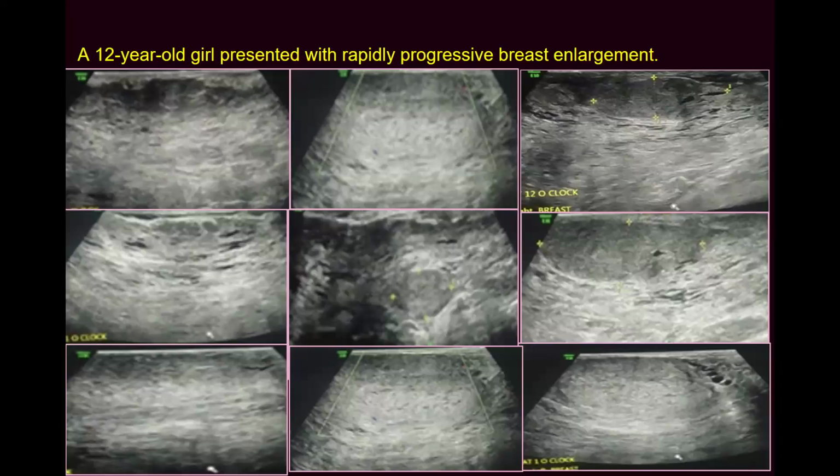It is diffuse and bilateral, both breasts diffusely seen like this, the whole breast like that. We have discussed this entity exactly in previous lectures. I expect you to remember. If this case was seen in lactation or pregnancy, it would be expected to see something like that.